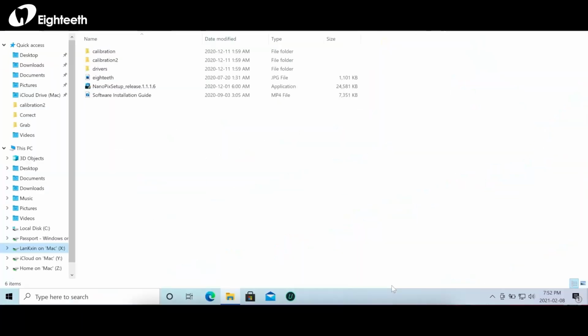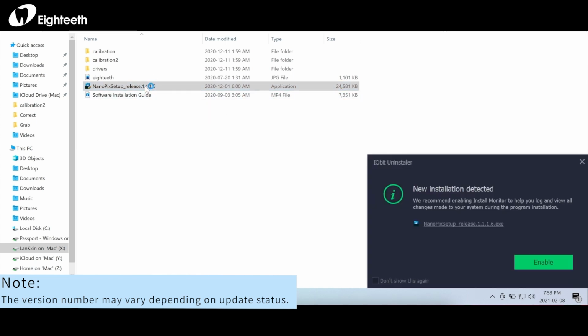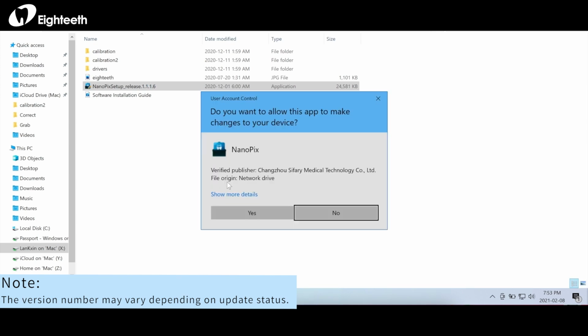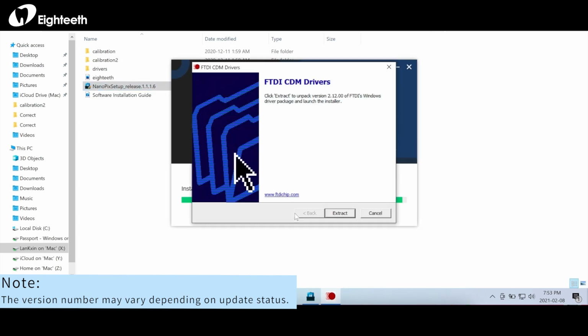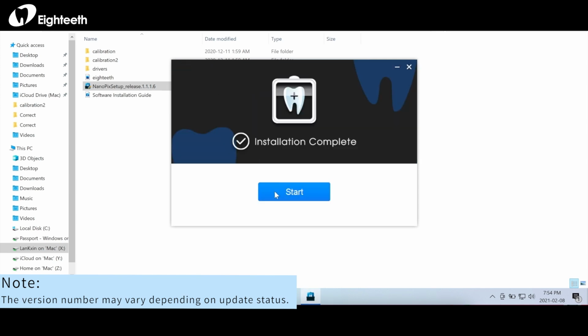Okay, let's get started with installing the software. After connecting the USB key, you can go ahead and click the installation application. This program is super small, and honestly, it's as simple as 1, 2, 3 to install it by yourself. The installation takes only about 3 minutes, and then we're ready to rock. All right, and now we're done.